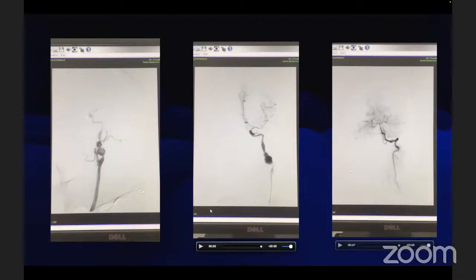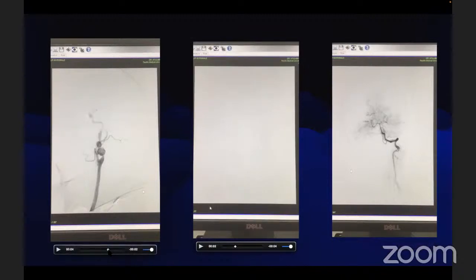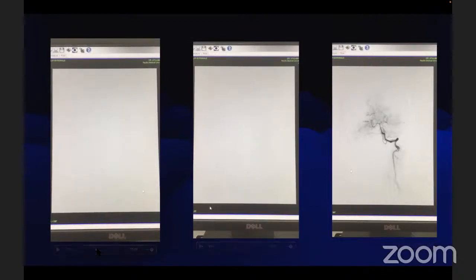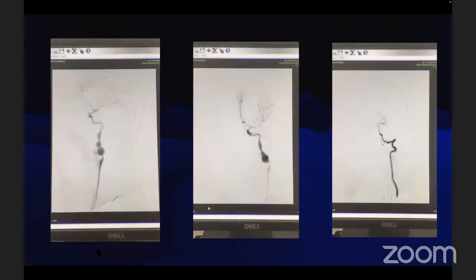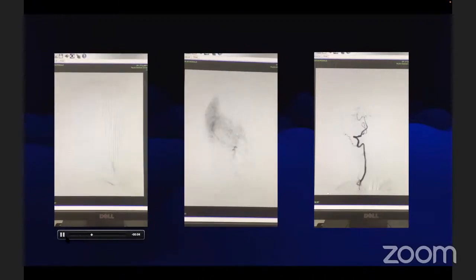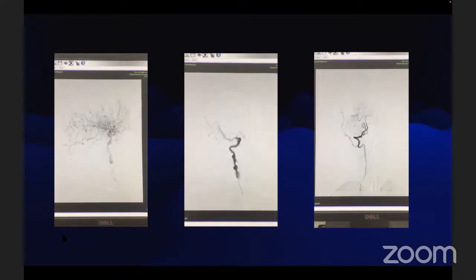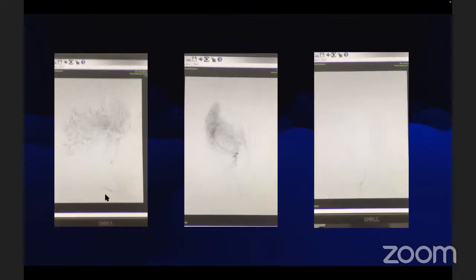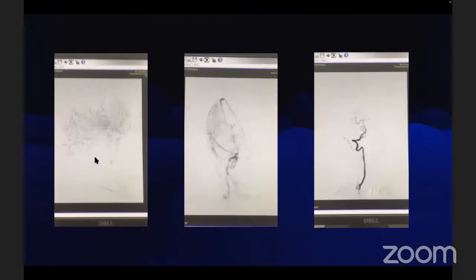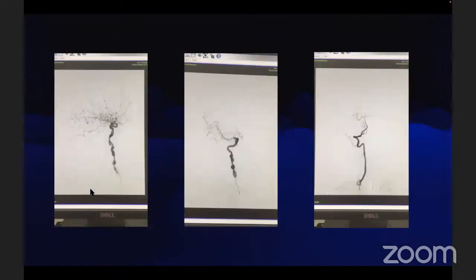Sir, can you comment on it? I'm not able to appreciate it actually. The previous slide. This is the left side and right side. Can you go to the above slide? Stop. There is a gap, no, sir? Where exactly can you see the two ICA?